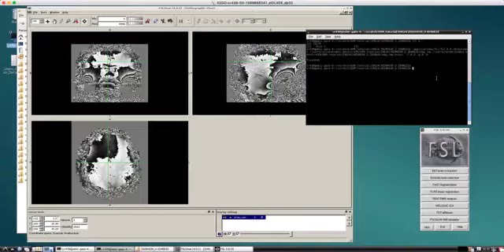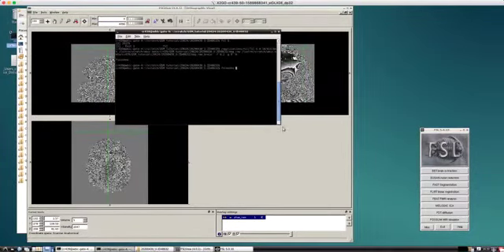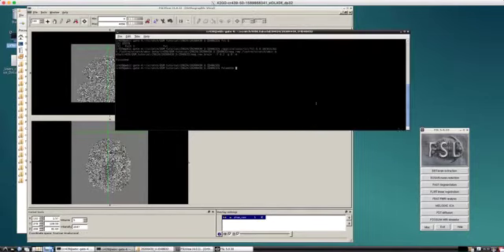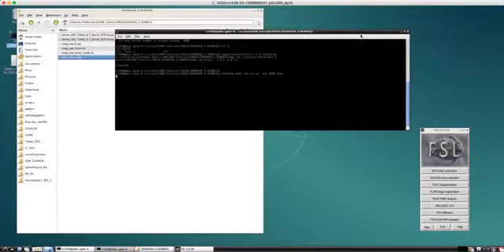So what I usually do is I just use FSL commands. In this case, I'll just put this here in the center. I use fslmaths, and I have my raw phase, and I just subtract half of 4096, which is 2048, and I give it a temporary image name.